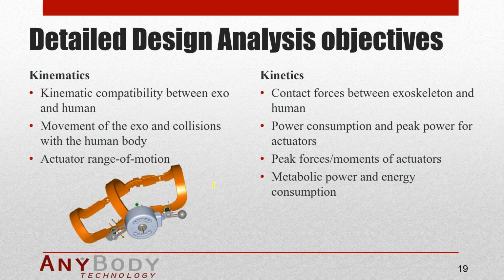On the kinetic side, it's particularly the contact forces between the exoskeleton and the human that are important. You might want to make a very strong exoskeleton that might allow people to lift very heavy things. But that probably also means that the exoskeleton has to transfer very large contact forces to the human body, and this might not be comfortable or even dangerous. And we can figure out with AnyBody what those contact forces are.